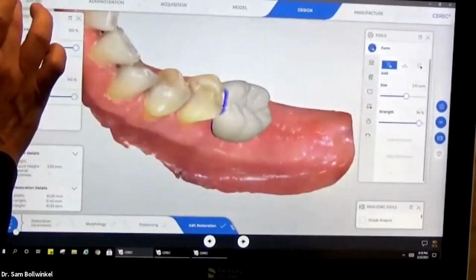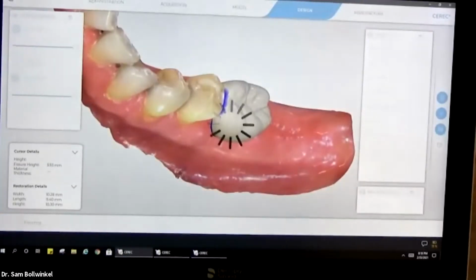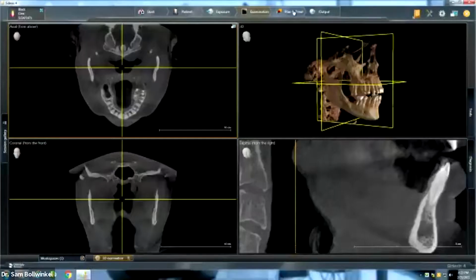With this information, I can now export it and send it to my files to now overlay it over the top of my cone beam. That is a ton of information. I know that we're going very quickly. We really want to demonstrate what are we, 9 minutes away, 8 minutes away, 11 minutes away from going live surgery. So there's a lot of information to pack in on the power of this technology, but that is super amazing that I can take that and now put it over our cone beam. So let's walk through what that looks like here on our cone beam.